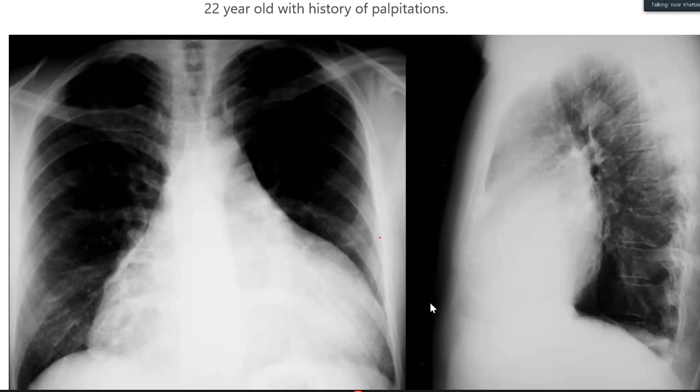In a 22-year-old, always remember that the retrosternal space is dark. It is not radio opaque like that. The spinal lucency becomes more towards the diaphragm, so the spine becomes more darker. The retrocardiac space is dark like that. Now, if you compare the retrocardiac space here versus here, there's something wrong here in conjunction with the large heart. So, why would a pericardial effusion cause the retrocardiac shadow to become opaque?